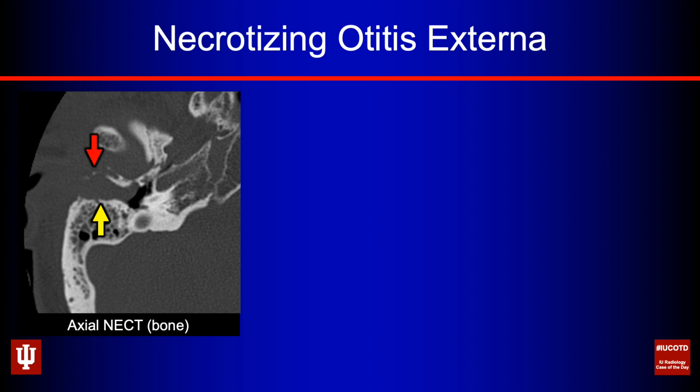We have some other areas where the back wall of the TMJ is getting eroded. This can be tricky because you can have little bone fragments that are just normally sitting out lateral there. In this case, they were becoming eroded. If you look at the contralateral side, that's oftentimes, not perfect, but oftentimes a helper to see how it should look in this patient. In this case, it's getting rarefied and eroded.